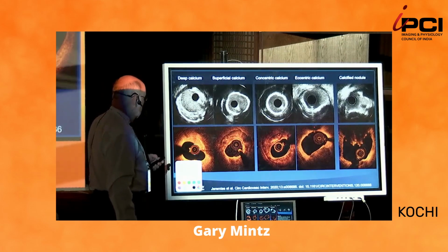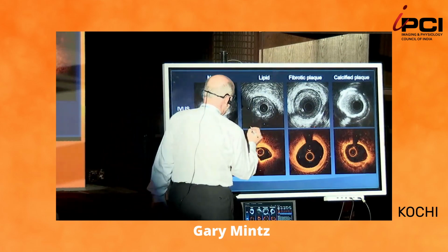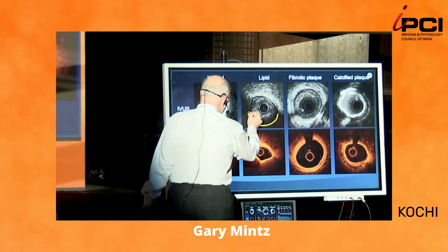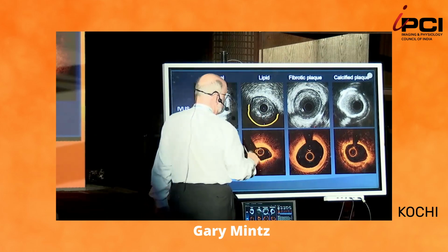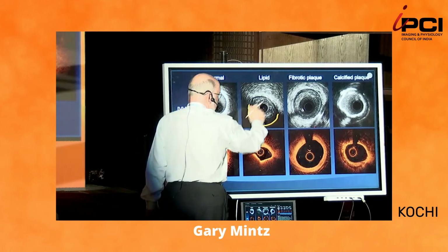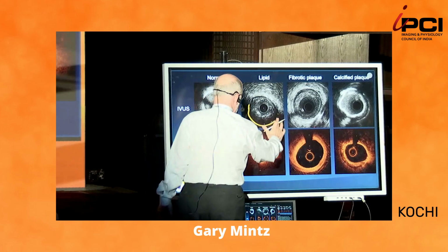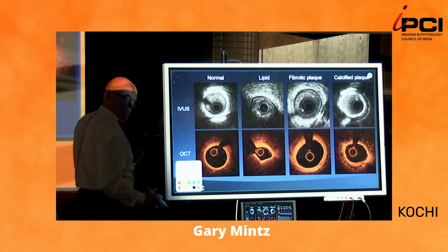No. You cannot diagnose that. When you have attenuated plaque, you don't see the adventitia. The adventitia is supposed to be here, but you don't see it, and it's hypoechoic, which means it's less dense than the adventitia, so it's a fibroatheroma. And the only two reliable tissue types that you detect by grayscale IVUS are calcium and fibroatheroma.